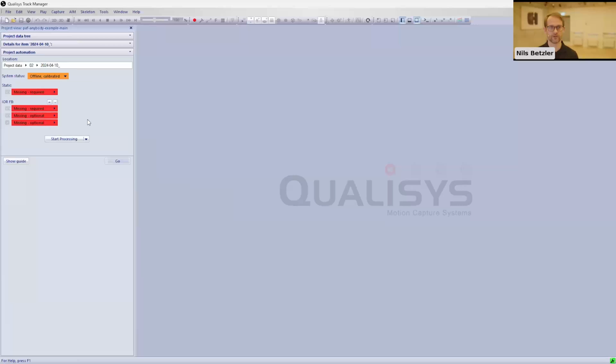So if you're using one of the open PAF examples, you can decide if you maybe have 3 different conditions you are testing. You can go into that settings.paf file and modify it and define these conditions, which makes it very easy for anyone who's running the Qualisys software to collect data, to make sure that no files are missing and that they are all named consistently and located in the right place.